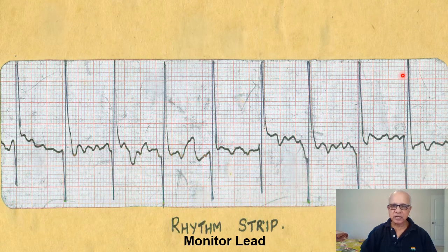My questions here are, what is the arrhythmia? What could be the underlying disease of the patient? What is the disease due to which she has been in heart failure and treatment? And third thing, what could be the cause of this particular arrhythmia which you are seeing here? This has a specific cause. What is that? So you can start answering this. I'll give you about 3 minutes for this also, because I know this is a little tricky.